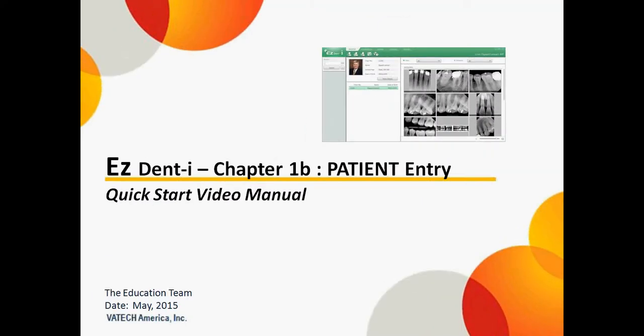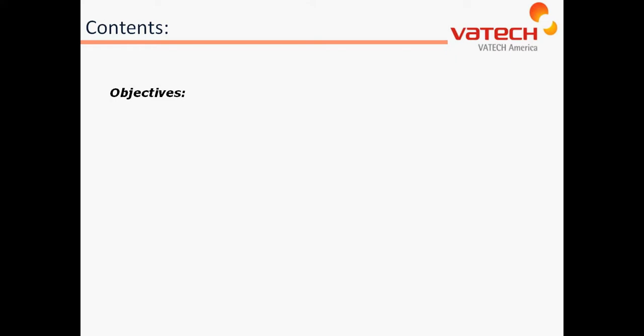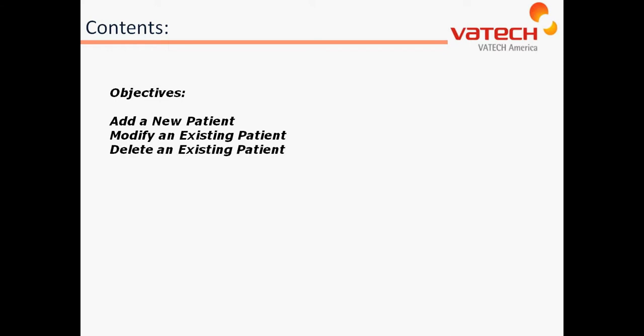Welcome back to the Vatech EzDent-i Quick Start Video Manual, Chapter 1B, Patient Entry. The objectives will be to learn how to add a new patient, modify an existing patient, as well as delete an existing patient. Let's first begin by learning how to add a new patient.